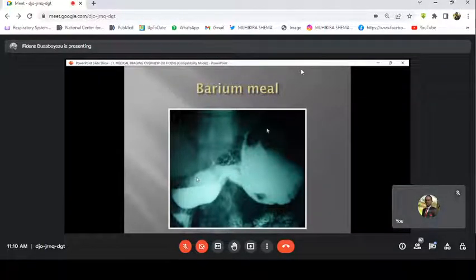So from there, you can follow and see where is the ulcer, where is the tumor. If it is normal, it is big. If there is stenosis, reduced in caliber, you can diagnose. And the contrast is the white, because remember contrast has a high atomic number, and that makes the film white.